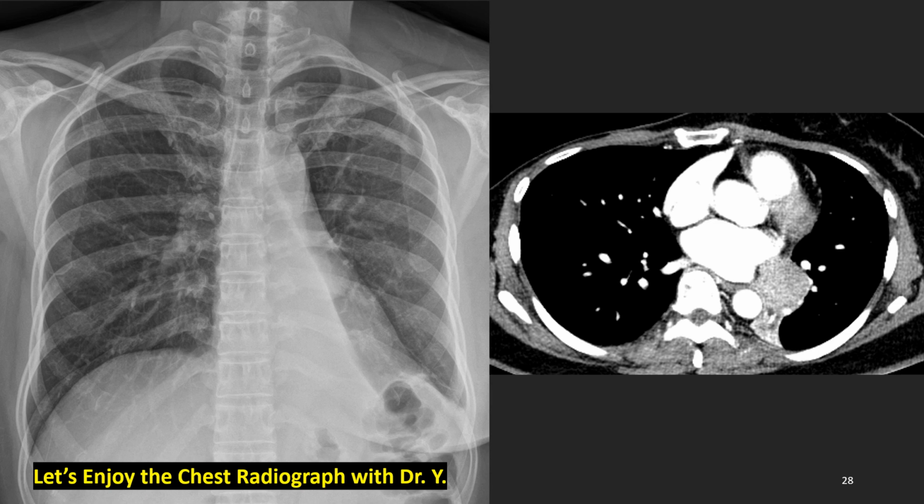Another inverted S sign on this axial CT. Convex proximal, concave distal. Convex proximal is well-enhanced mass such as carcinoid and distal collapsed left lower lobe. This must be that mass on the CT. Yes, left lower lobe collapse. Very characteristic findings.